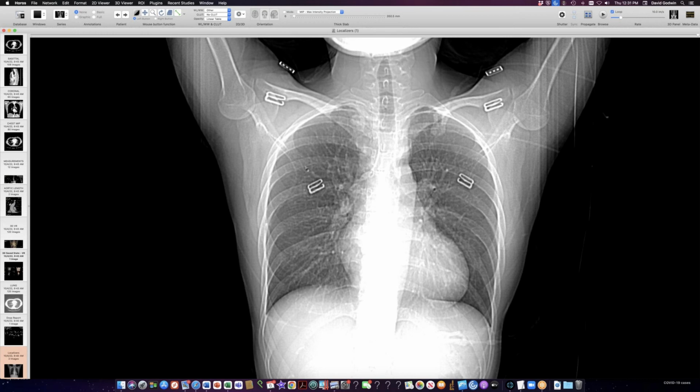So normal heart size, and not that abnormal a contour to the aorta. There's a little bulge above the aortic arch up here, which corresponds to a slightly dilated subclavian artery, which goes along with coarctation. Rib notching, I don't know, maybe there's a little notch here underneath the surface of this rib. It would be nice to have a formal chest radiograph. I might be able to reconstruct one from the CT and generate a fake chest radiograph.